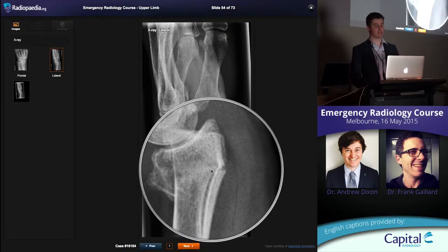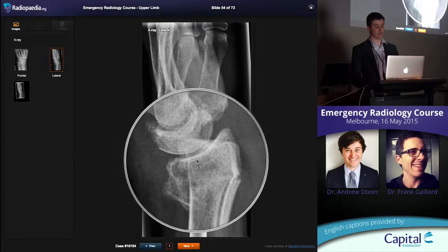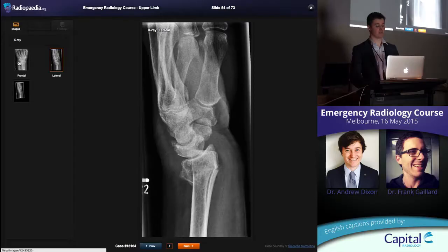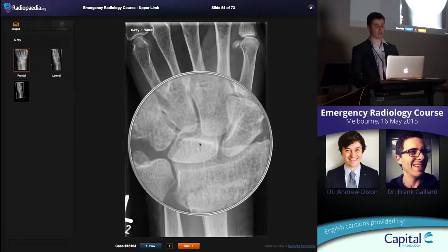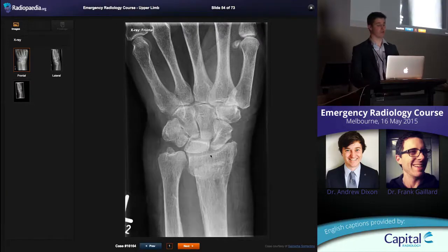Okay, so impacted. You can see some angulation here, so the bone's coming along, and then this part of the radius, the distal radius, is angulated dorsally relative to that. So transverse impacted fracture of the distal radius with dorsal angulation. Important thing is to look for intra-articular extension, looking along this margin here and seeing that you're not seeing any displacement, there's no cortical step along there, there's unlikely to be an intra-articular extension of this fracture. Look at that perfect line out the back, and in between you're not seeing any lucent line running to the surface. Okay, so non-intra-articular fracture.